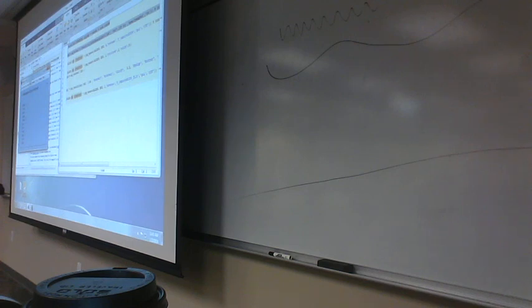Okay, and so you guys notice how the computer is being really helpful for us in all of our file names, because it always adds a little description about what you did to the data. So next week, when it's Thursday night, you're trying to get ready for class and prepare for your quizzes, or what I might ask about what you should remember about what our processing steps were, and you want to work with your data or know what's done with it, you might have forgotten everything you did.